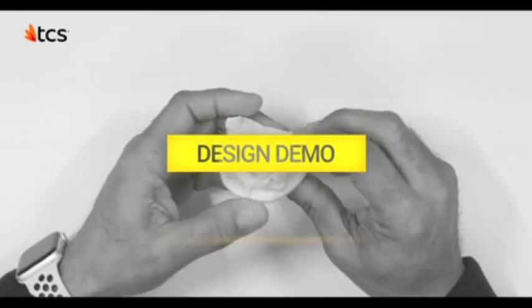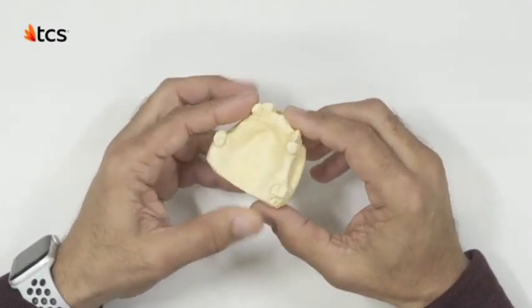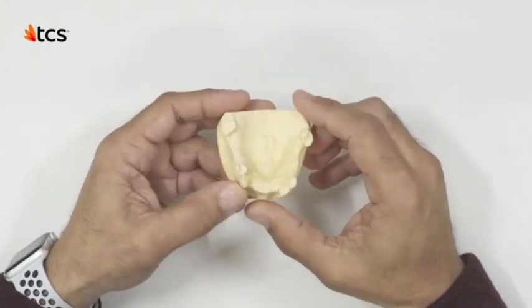Welcome to Design Demo 1. Begin by assessing the design plan and amount of undercut needed for your case.